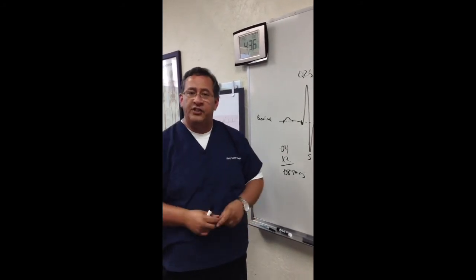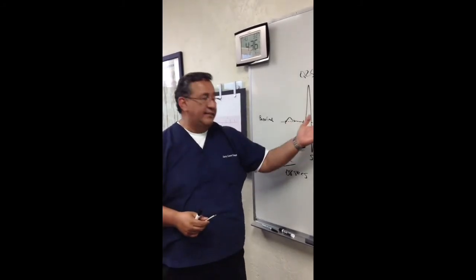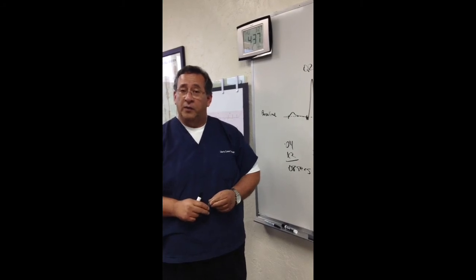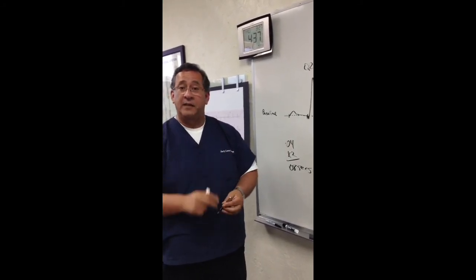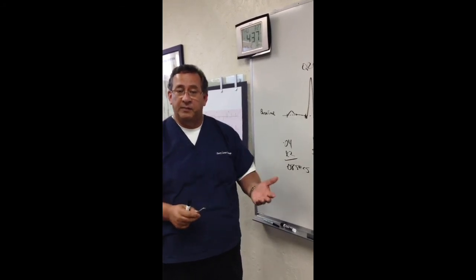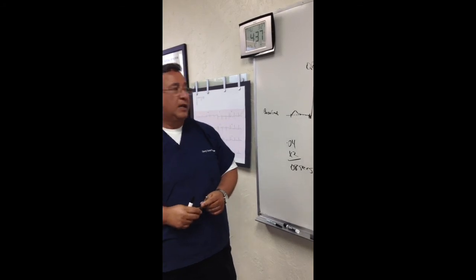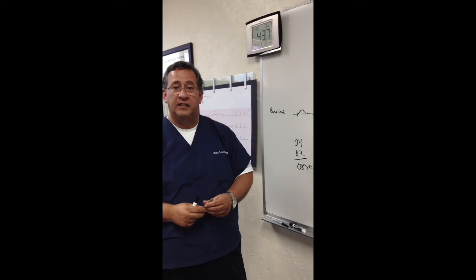If you're running an EKG on a patient and they're telling you they're having chest pain and you see this ST elevation, that's something I'd want to let the doctor know about right away. In fact, I would run the EKG, take it to the doctor and say, I have some ST elevation here, doctor. Patient's complaining of chest pain. I'm sure the doctor would appreciate you telling him that. Okay? So remember, no math. We're just evaluating the appearance of that ST segment.